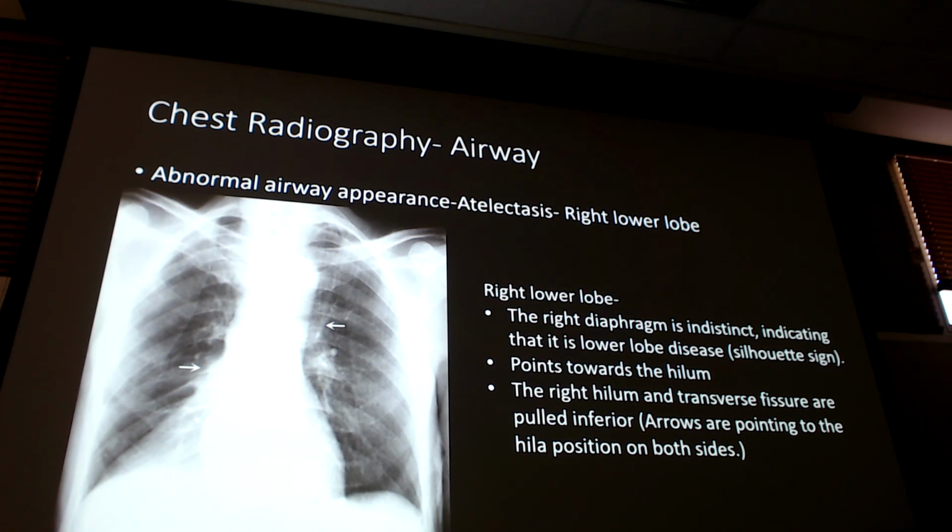On top of that, I recognize that this particular picture, right, I can't see the spine vertebrae, so it's a little underexposed, but kind of trace the spine down. Look at how much right atrium I have. Look at how little left ventricle I have. Why? It's pulling it over. It's pulling that heart and that mediastinum over to the right side. So therefore I'm losing some of my left ventricle from what I've seen.